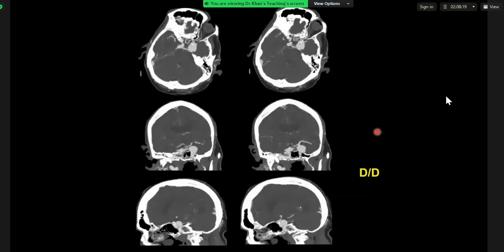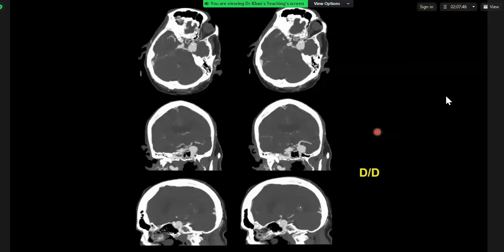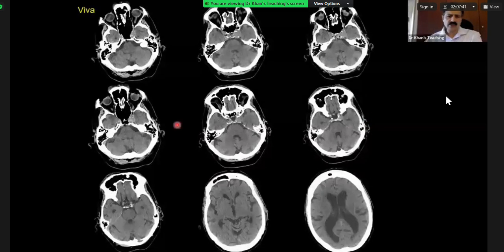Okay, so on these volume images, I can see that there is what looks like an aneurysm in the region of the left cavernous sinus. So means it is arising from? I think it's arising from the ICA. Which portion of ICA? The cavernous portion. Excellent.